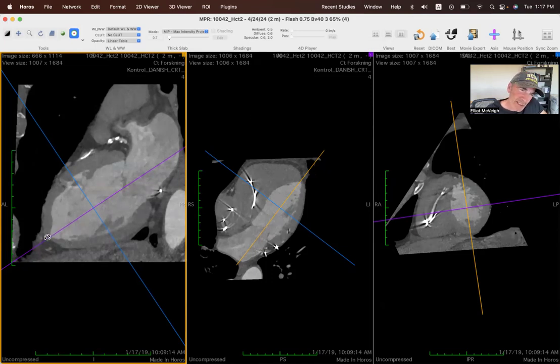In order to click it down there, I have to shut these lines off, because as you can see, if I do anything, I'm controlling the line. I can't put my point right over top of the line, unfortunately. So I need to take my mouse over here, shut those lines off by clicking off the axis, and come back here and put the point there. I'm going to go back, turn those lines on, watch where that line is in the apex, shut it off, and then that's my point right here. So I'll click that point, and that is the apex.